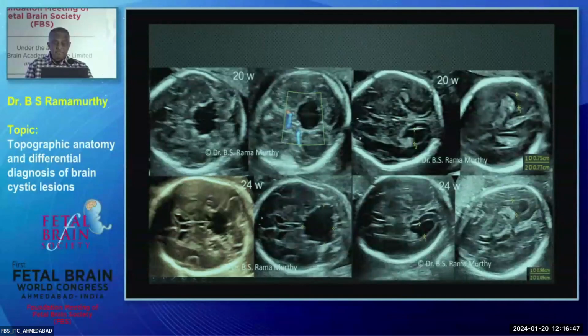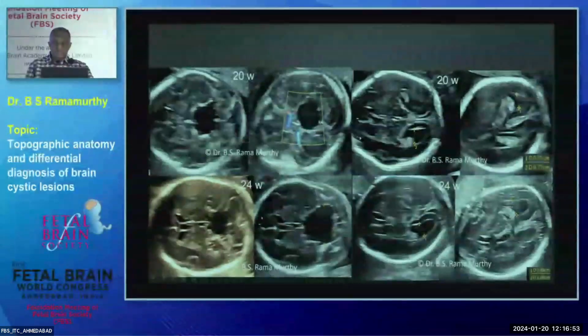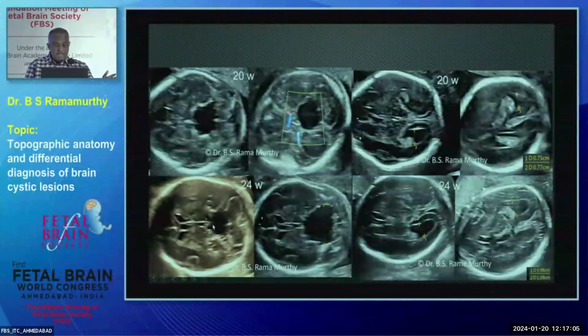That is the cerebellum. It's extraaxial or intraaxial? Extraaxial. It's extraaxial. Now, supratentorium looks normal except 7 and 7 millimeters, no ventriculomegaly. And you will see that this is anterior to the cerebellar hemispheres. And when I come up, it's posterior to the cerebrum that you can see here. So where would you locate the cyst?